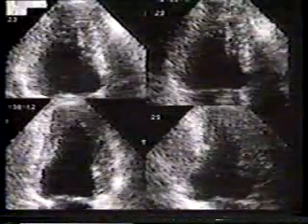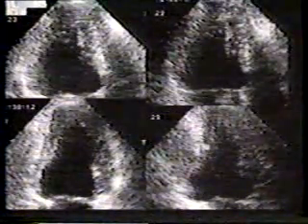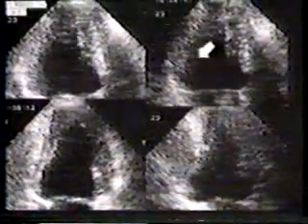This 51-year-old male was referred primarily for evaluation of hypertension. His ECG was interpreted as showing a possible inferior infarct. His standard treadmill exercise test was interpreted as being abnormal, but not diagnostic of ischemia. His rest and exercise apical 4-chamber and 2-chamber images have been captured with the frame grabber.